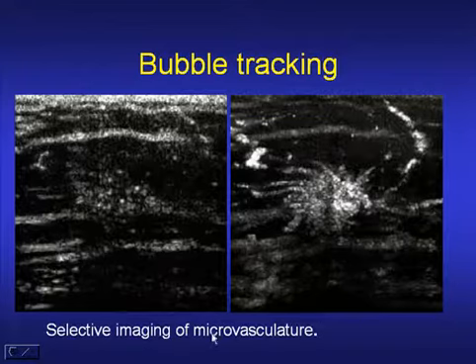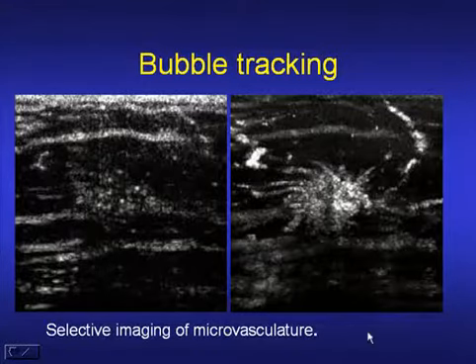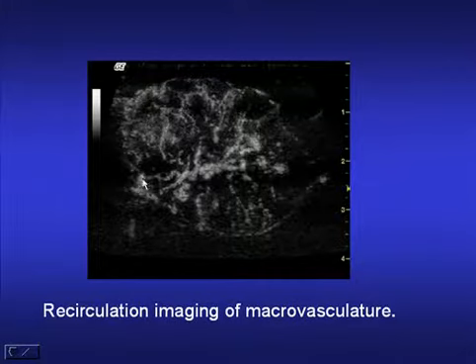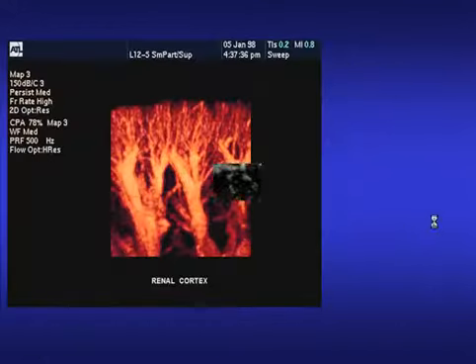And this technique of microvascular imaging, or MVI, as some of the manufacturers call it, is extremely powerful in imaging structures such as the breast and the prostate. It can be applied to larger lesions in the liver, again looking at late phase imaging, looking at smaller numbers of microbubbles as they slowly traverse the lesion, so we can build up a pattern of both small and large blood vessels within the tumour and see exactly what is happening.